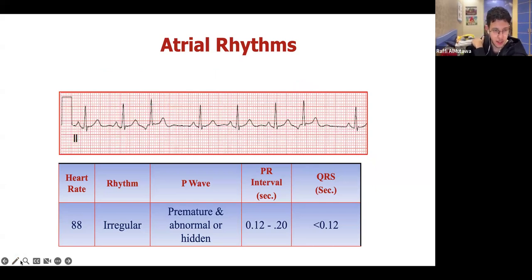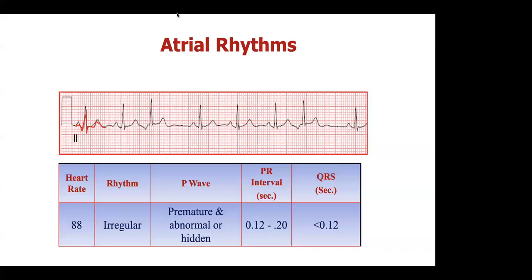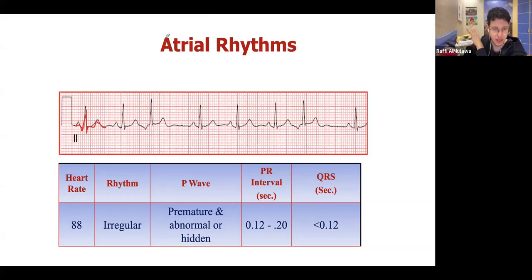This QRS, just this one right here. The line, I don't like this line. Okay, let's go back. This QRS right here. Is this normal? Yes or no? Yes, it's normal. Okay, this QRS over here is normal. This QRS after it is also normal. So these two QRSs, until now, before this contraction, we have normal sinus rhythm. Let's assume the entire thing before this is like this. This is normal sinus rhythm. Yes or no?